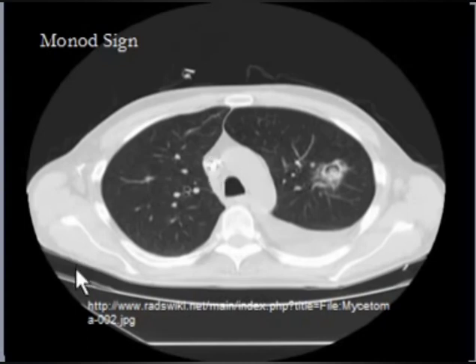That's all for now, but we will certainly use this image again to describe a few more things in future. This is a very interesting image.